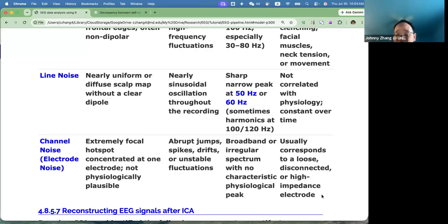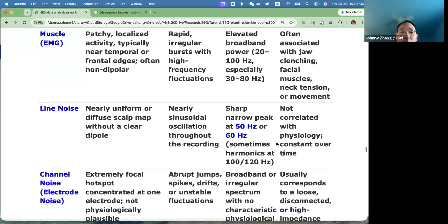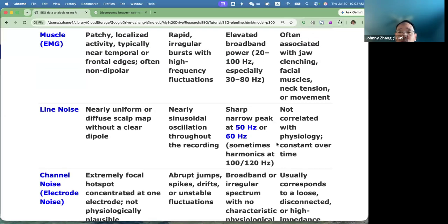It's actually very difficult for me to identify the artifacts. But oftentimes after I do the data analysis, I show the results to the EEG researchers, and they can help locate the potentially problematic components, and then we can remove those components later on.